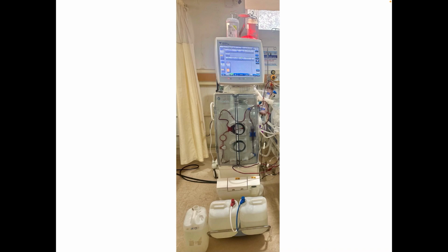So one part of the machine is the arterial line, that brings blood from the patient to the machine, till the dialyzer, and then a venous line that takes the blood from the dialyzer to the patient. Now the arterial line, the blood has to come from the patient to the dialyzer. That requires some force. As we know, the dialysis line is present in the venous system, in the femoral vein or the inferior vena cava. So to generate pressure we need the use of a pump.